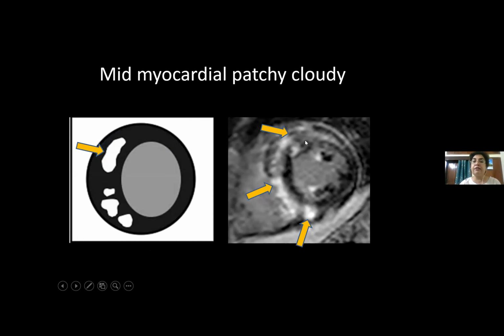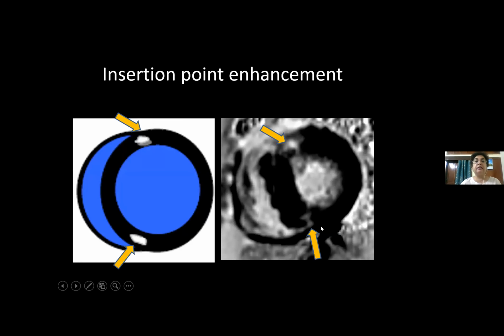So this is a real-life MRI image showing the finding of intense, patchy, cloudy, mid-myocardial, epicardial enhancement. This is the insertion point enhancement, which I had described earlier.